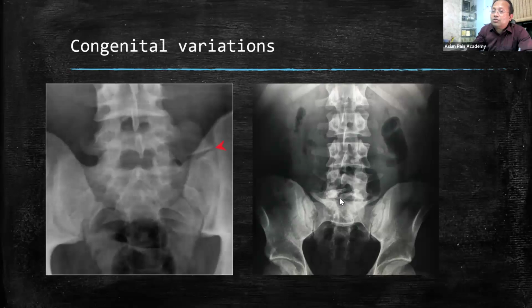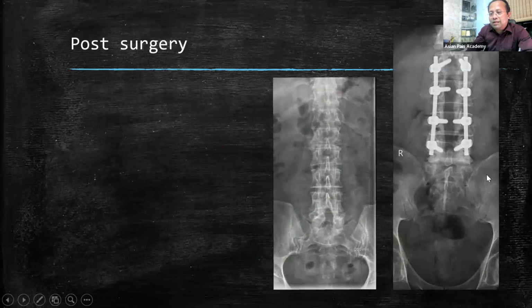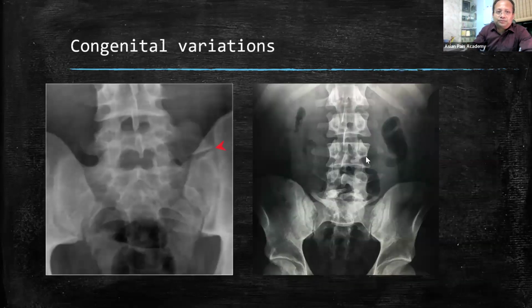Why you must know? Because it not only helps in diagnosing. Another thing is, if you plan for a procedure, you must know where the screw is. Sometimes, due to the screws, some procedures become more or less impossible. If you plan, take the patient to the OT and the OT bed, and then you cannot do that procedure. So it is better to anticipate things prior. So you see the X-ray and note these things.